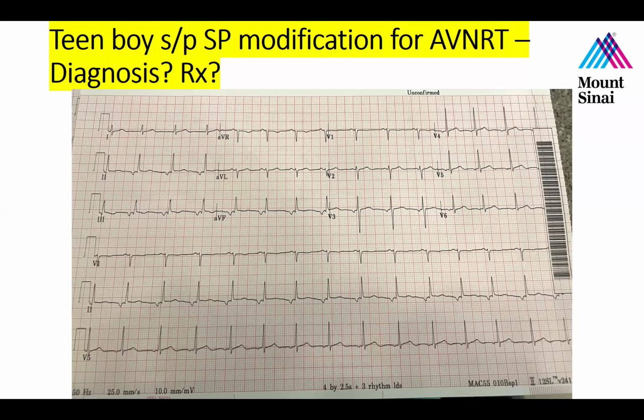It doesn't necessarily look like there's pre-excitation. I don't agree. It does not, right? We have a nice little Q wave. Yeah, but I would argue V3 has a little bit, but in some of the other leads, it's clearly not. Also you'd like to imagine, though it's certainly possible, that your favorite electrophysiology team of Love and Pass would not have missed pre-excitation in someone who was just ablated for AVNRT. But, you know, stranger things have happened, that's for sure. But that's unlikely.